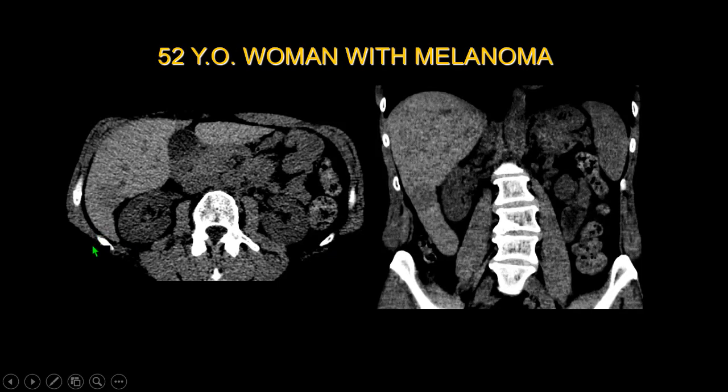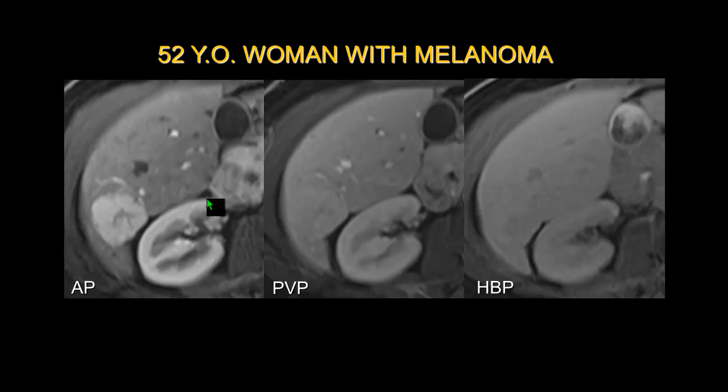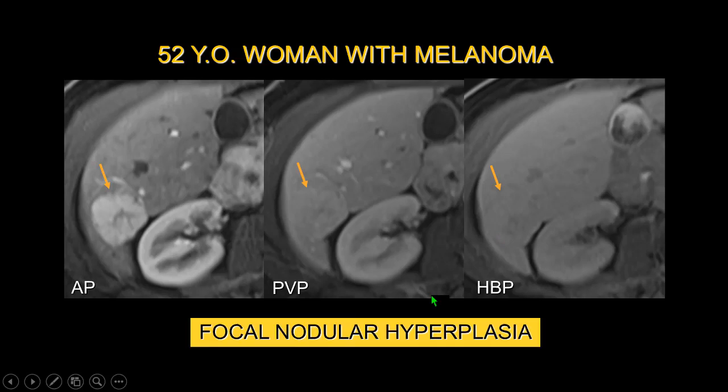Now, this was a woman who came to us with this study from an outside institution with newly diagnosed melanoma, and she had this hypoattenuating lesion in her liver. So again, we did MR with a hepatobiliary agent. And as you can see, this lesion has the typical characteristics of focal nodular hyperplasia, homogeneous enhancement during the arterial phase with a central scar. It equilibrates with liver on the portal venous phase, and then it shows enhancement during the hepatobiliary phase. So typical focal nodular hyperplasia.